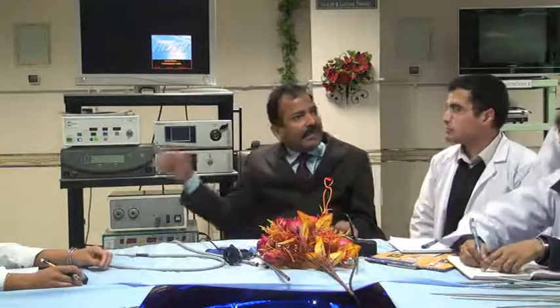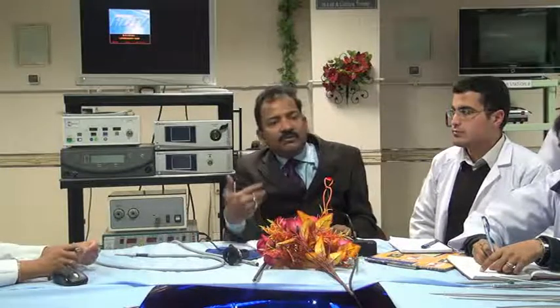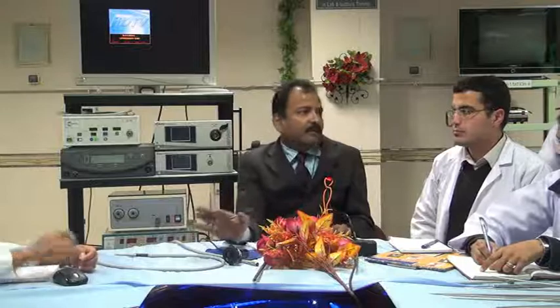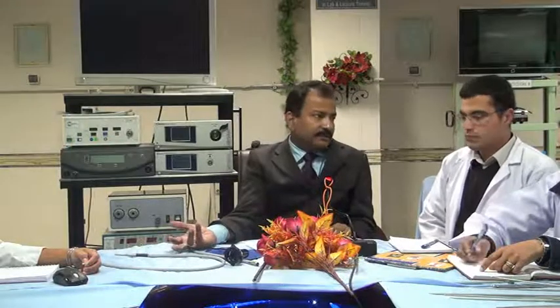Fiber optic is only in the light cable, and that has broken fiber should be inspected. If more than 10 to 20% broken fiber, you should throw the light cable, buy another. It cannot be repaired. But if you keep it carefully, it will last for many years. If you do not keep it carefully, maybe in a few months it will break. How you keep it, that is important.